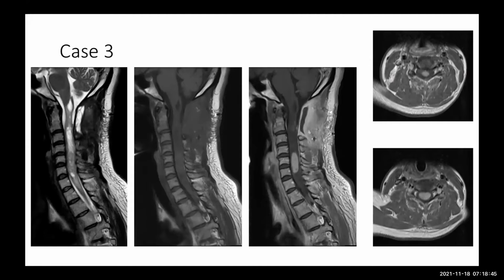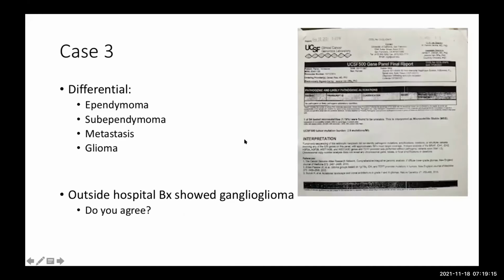It's hard for me to believe it's a ganglioglioma. I mean, it is very avidly contrast enhancing. It's intradural intramedullary. I guess I never would have put ganglioglioma on my differential for intradural intramedullary, but maybe I should consider it now if that's really the case, though I would be very hard pressed to believe that that's true. That's fine, that's your opinion. I would tend to agree, considering this well circumscribed lesion. But we will now see what Dr. Saad has to say about it.